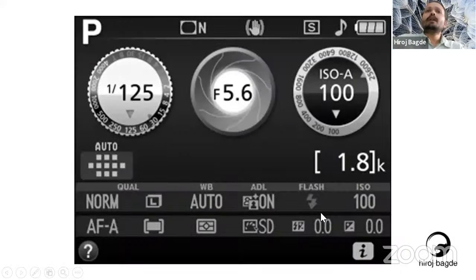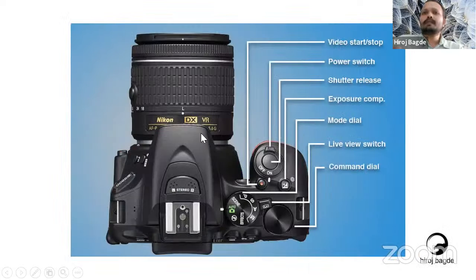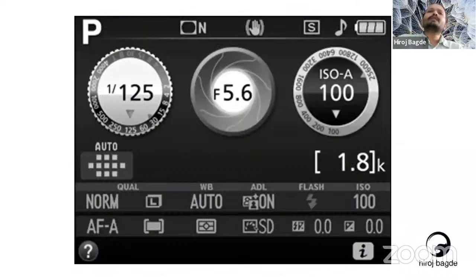Now this screen which I had mentioned, once we go into the live screen of the camera, we have this screen in front of us. Now you just go through it. This P is the same P which was inside the mode dial. Can you see this mode dial button? We have this P. Now this P is called the programmed auto. So now I've shared the screen which tells us about the programmed auto mode. In programmed auto mode, the camera itself decides what kind of auto mode you need. You can fill in some parts of the ISO adjustment, but you cannot change anything else.